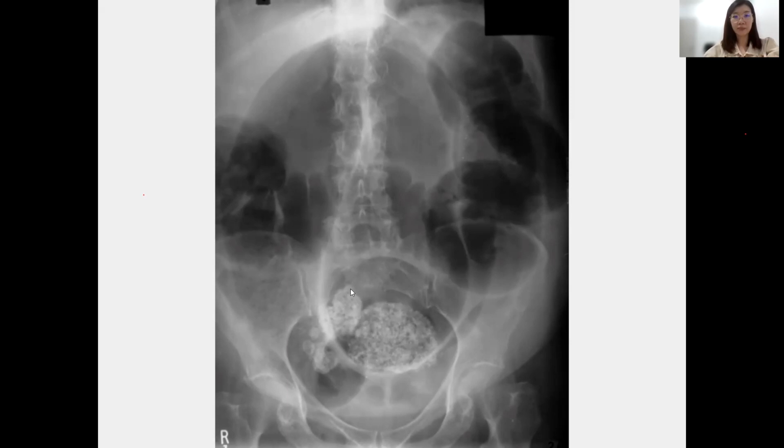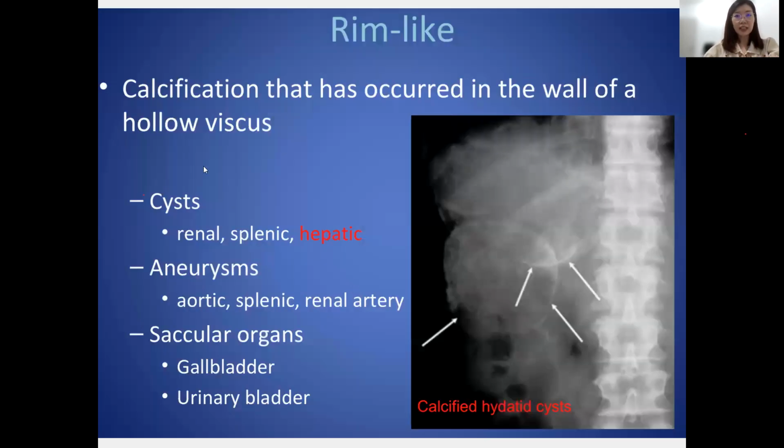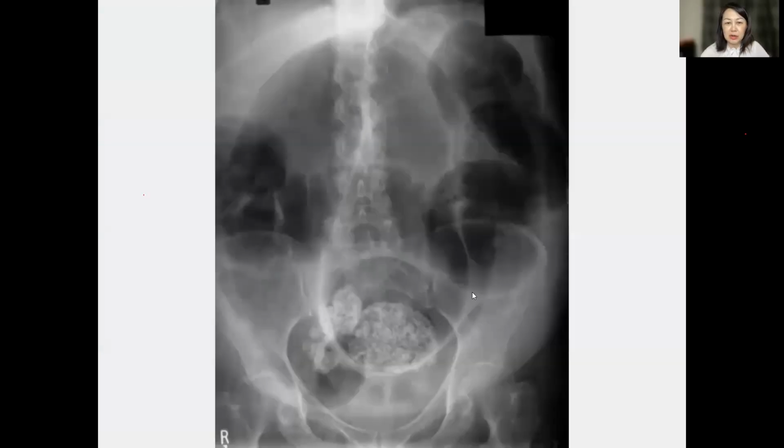These are emergencies. Why is the thing in the middle? This one? This one is fecal material. Oh, I see. Okay, fecal material like this, like gauze.